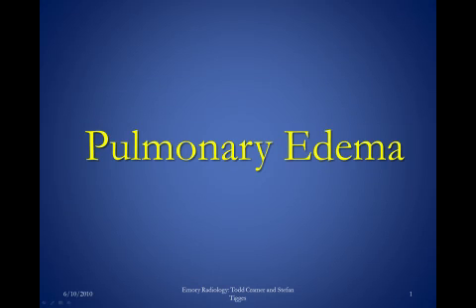Hi, this is Todd Kramer with Emory Radiology, talking about one of the 22 can't-miss diagnoses for medical students. My hope is that after watching this podcast, you'll be able to recognize some of the common manifestations of pulmonary edema seen on a frontal chest X-ray.